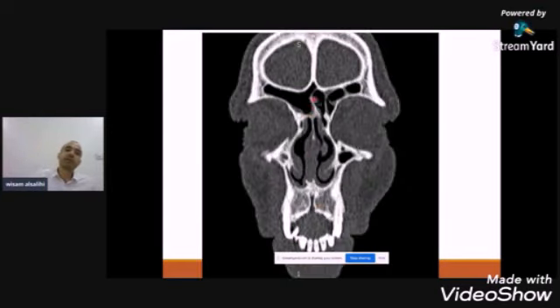More posterior to see the frontal sinus. See the right frontal sinus: there is continuity between the lamina papyracea and the bone of the nasal septum. So this is the frontal sinus. And here there is no continuity between the lamina papyracea and the nasal septum, so this is the frontal recess. The maxillary sinus starts to appear, and this is the first ethmoidal cell, and this is the agger nasi cell. This is the nasal septum, and this is the incisive canal and foramen.